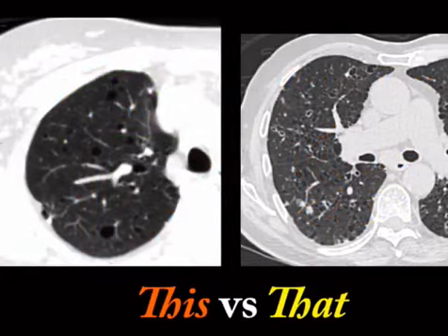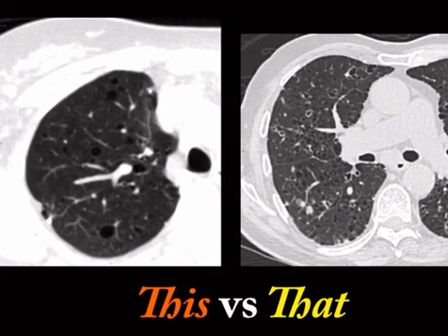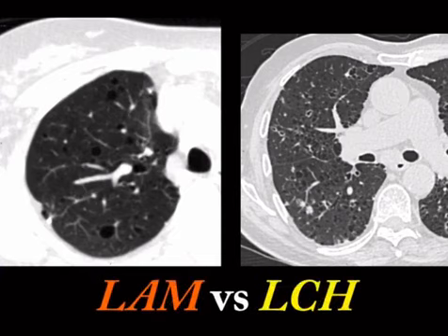So another really classic this versus that is cystic lung disease, where you have LAM, which has these thin-walled cysts, all about the same size, no nodules, versus LCH, where the buzzword for these cysts is bizarre, and they have nodules associated with them.